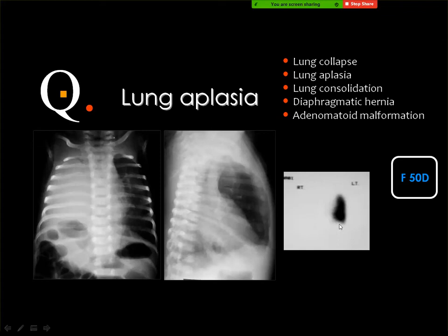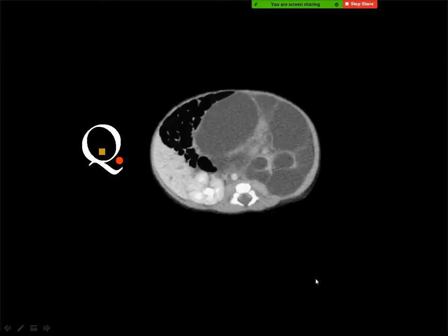But without this image, you may say that this may be a pleural effusion or maybe a hypoplastic lung, but you cannot see the aeration. There are many possibilities for this. But whenever you do not see any perfusion, you know that the lung is not there.